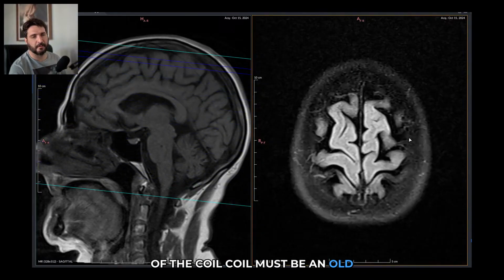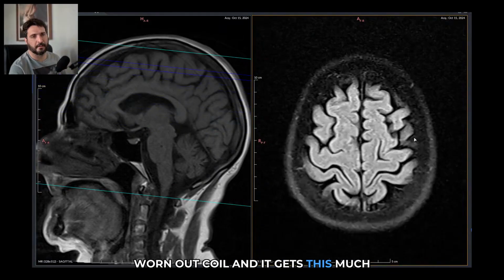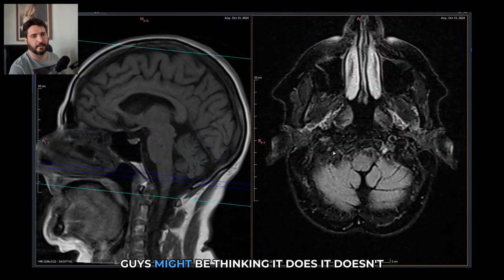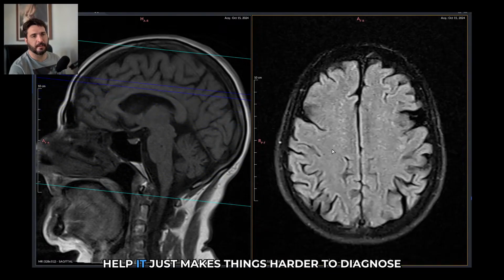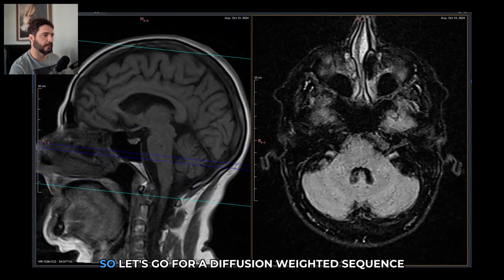Coil must be an old, worn out coil, and it gets this much noise, which hides small lesions, as you guys might be thinking. It doesn't help, it just makes things harder to diagnose.